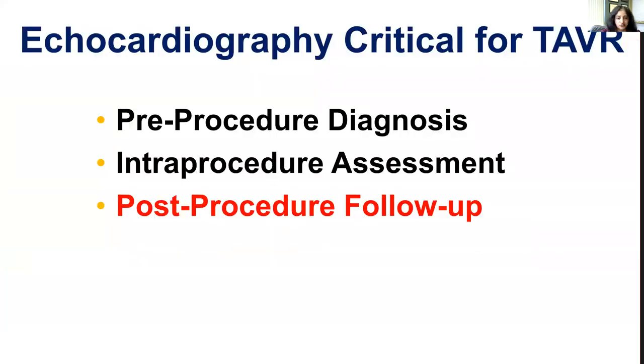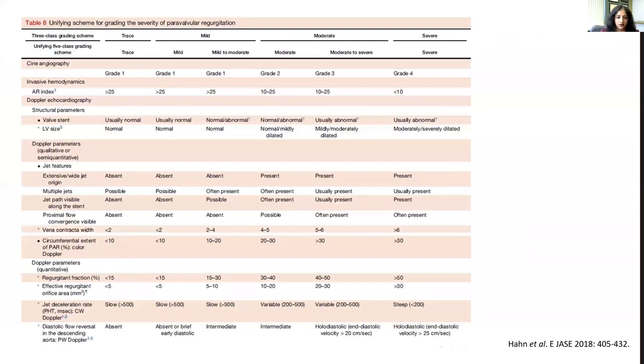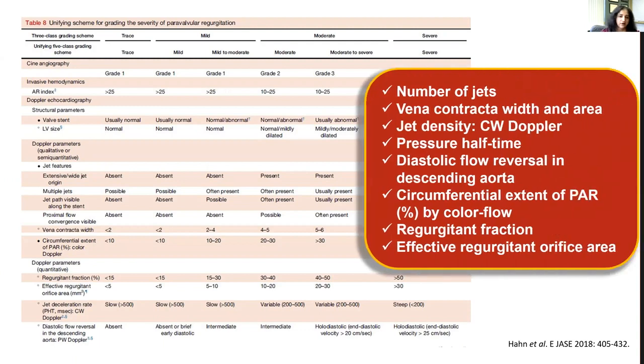We next turn to post-procedure follow-up of the TAVR. And here, either the next day or at the 30-day mark, you have more time to really quantify and assess paravalvular regurgitation. And here are a number of parameters that you can consider.